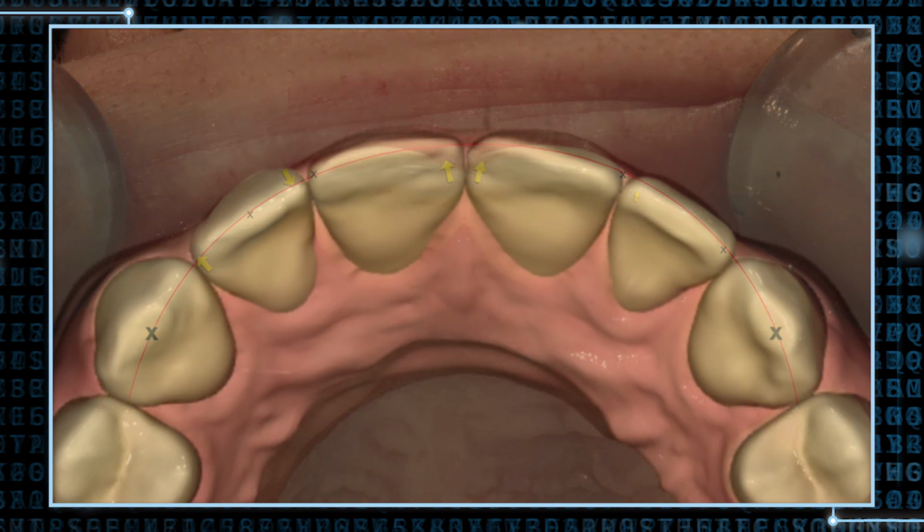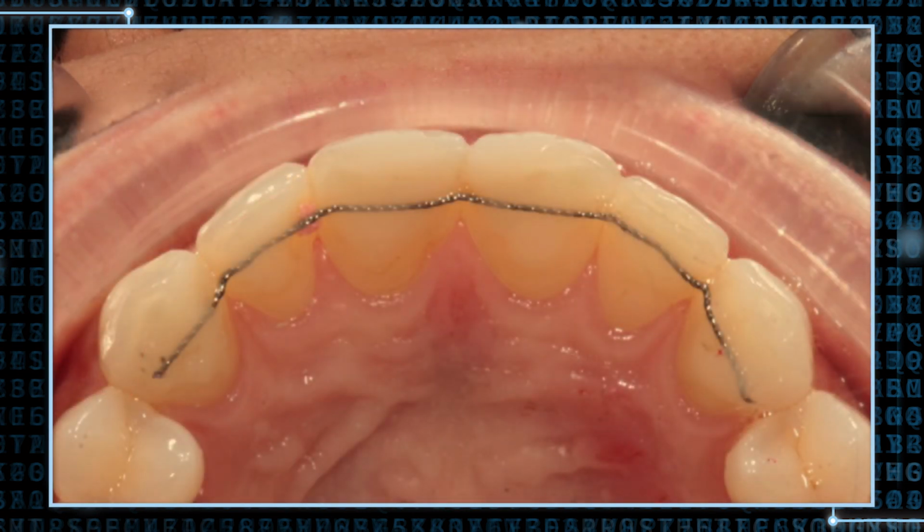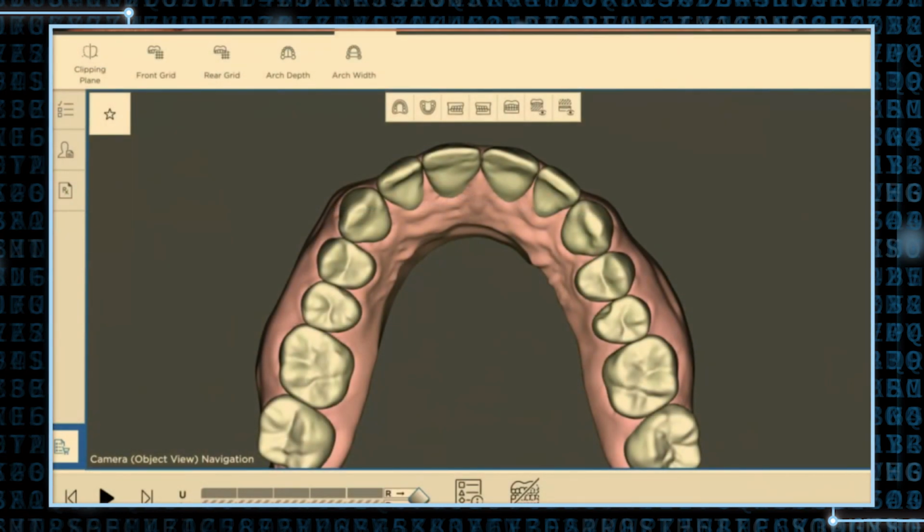So that's just the position that came back, which obviously is exactly correct. You'll see in a second the end result. This is where we've ended up. Obviously, there's a retainer on now. And here is the animation.